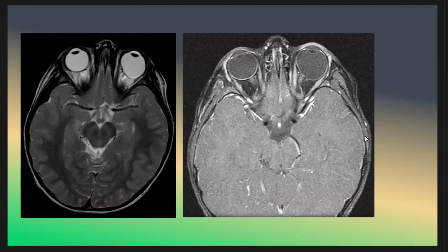What do you think the patient has here? Compare the eyes. You see the eye here, it is okay. And the eye here, it is bulging posteriorly. And this is a coloboma. And also you should know at least one or two syndromes associated with the coloboma. One of them is aniridia, but the patient here, the lens are there.